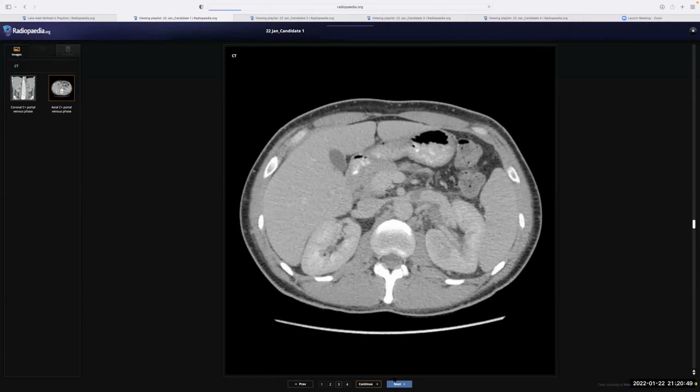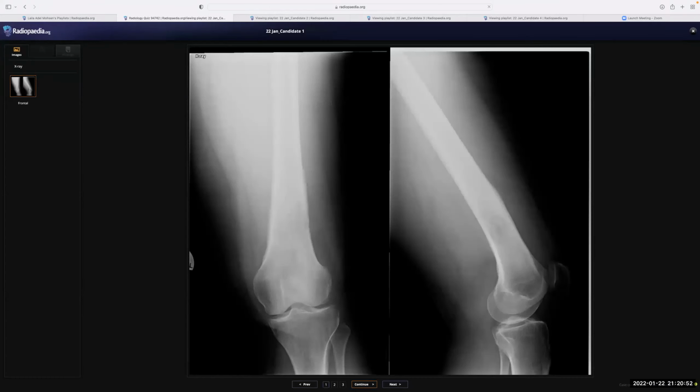Okay. So next case. This is the X-ray, frontal and lateral radiograph of the knee joint, including the whole of the femur. I am trying to make out there is an abnormality in the distal metaphyseal region of the femur, which is showing some cortical irregularity in this area.